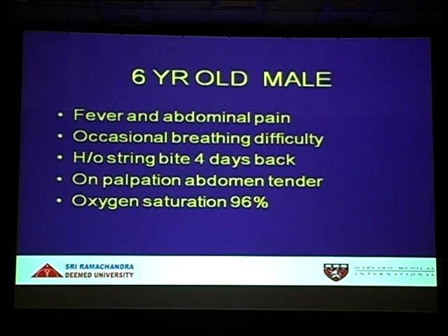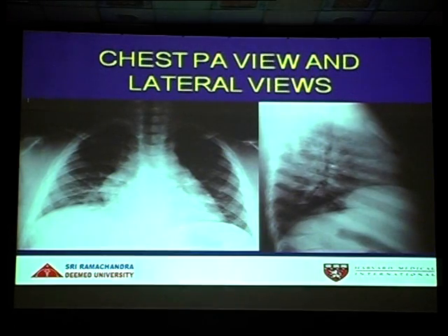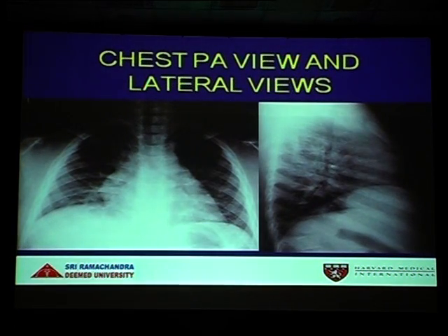Yes, chest X-ray, isn't it? So this is immediately, as soon as the baby has come to the casualty, an X-ray was taken. X-ray chest PA and the lateral view is taken. Are you seeing any abnormality in this chest X-ray?